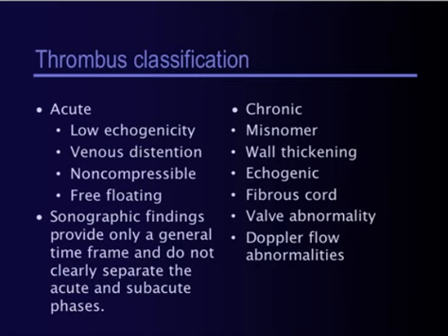And in the chronic setting, if the vein remains completely occluded and becomes a fibrous cord, one pitfall is to avoid mistaking a large collateral vessel for a native vein. Usually a collateral vessel will have an abnormal Doppler spectral pattern.